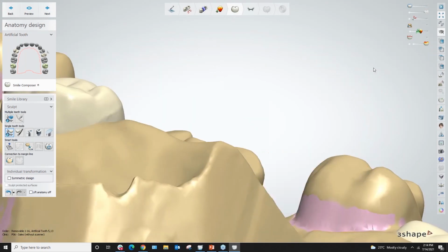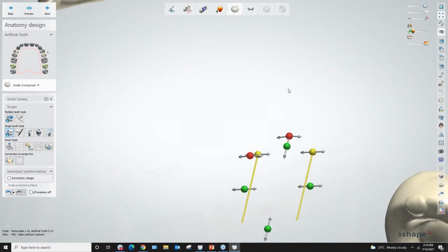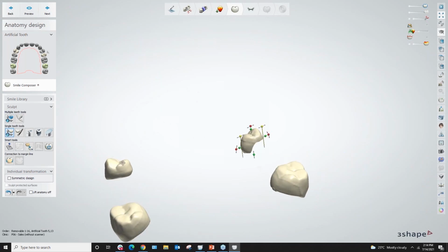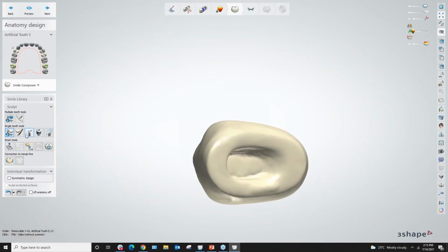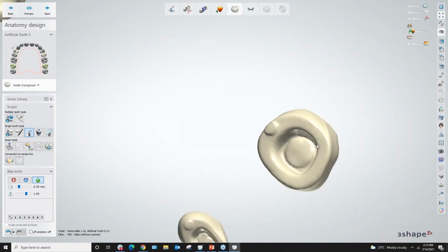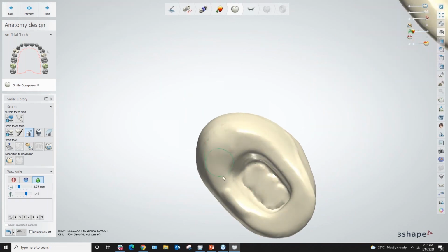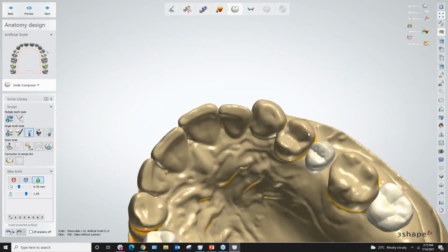If I'm not happy with the bottom of my tooth that I'm working on, I can definitely get rid of my model and just go ahead and use my smoothing tool again, activate it, just really focus in on this particular area. So same thing on the opposing side. If I would want to really go ahead and smooth out this area, then totally workable. Bring back my model.